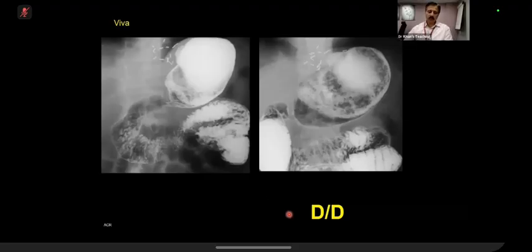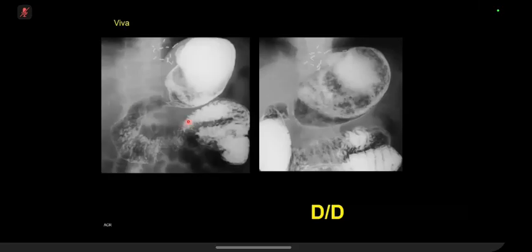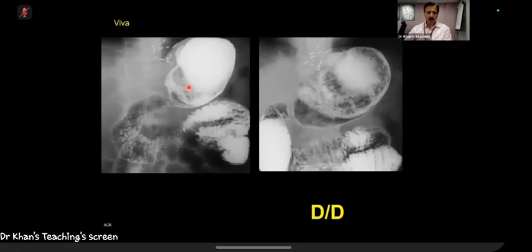Okay, I'll take over. Now, this is very well done, and you can mute yourself now. Thank you. Next will be candidate 6. Be ready. Let me tell you about this film. Now, on this film, there is something here which has got this mottled type of appearance. With that, there is antrectomy. So this is again Billroth 1.